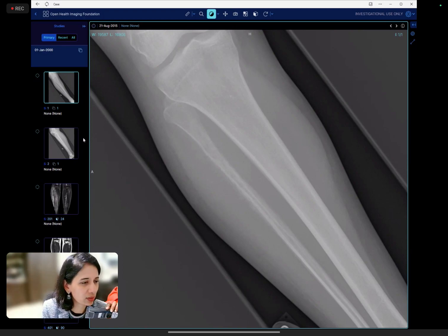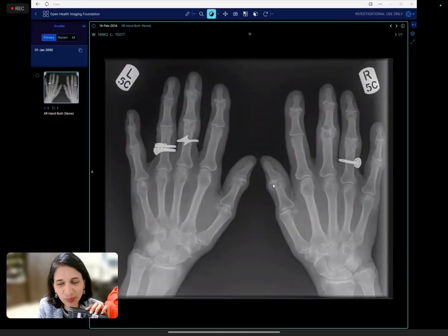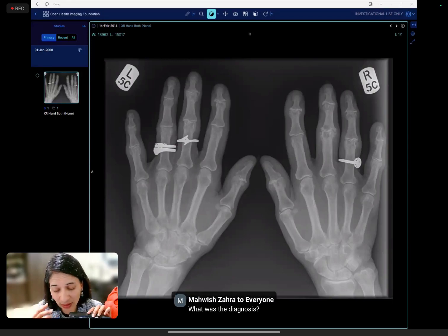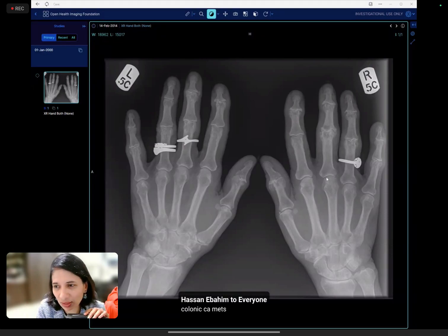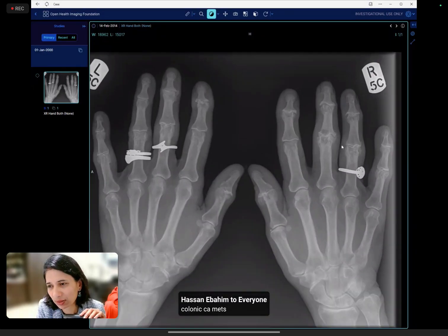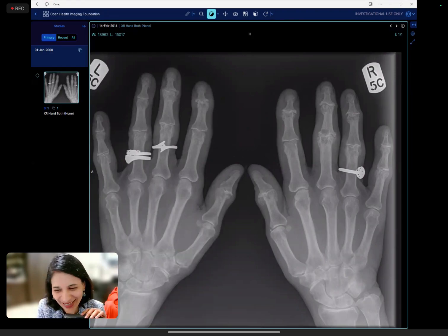So case number 36. I'm just trying to keep to my theme. I said in the last session that definitely I'll show you one periprosthetic so that I cover most of it, and all the hands, the different kinds of arthritis. I think we did gout last time, and we did psoriatic. So this is typical of, when I asked you, you coned into that.